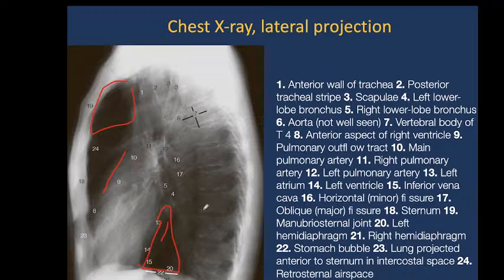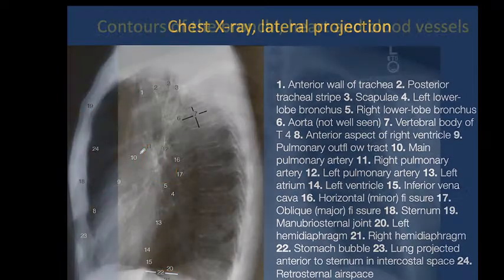You should remember that this is a projection of the two lungs, and we see structures combined in one place, but they belong to the right and left lungs. We see all structures layered in one place of X-ray imaging.